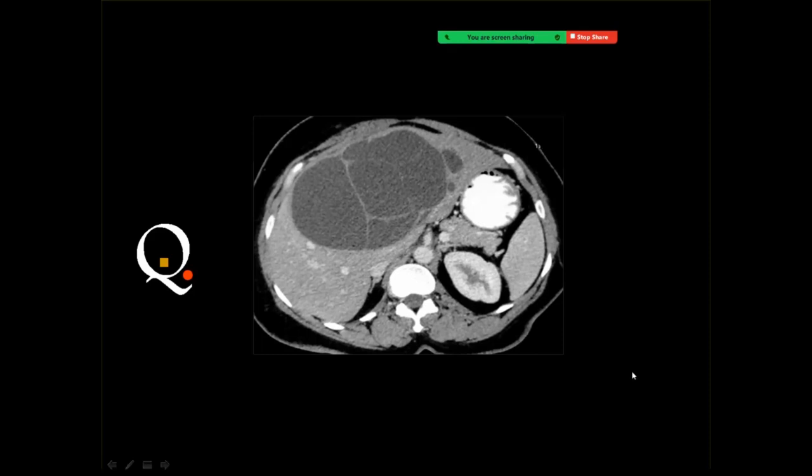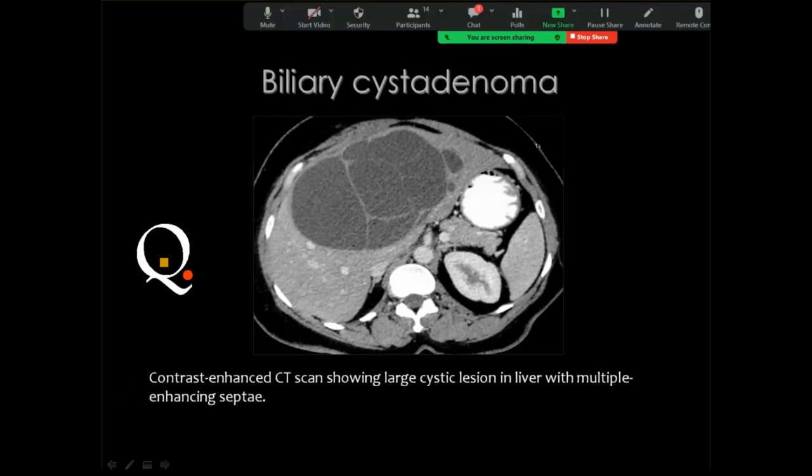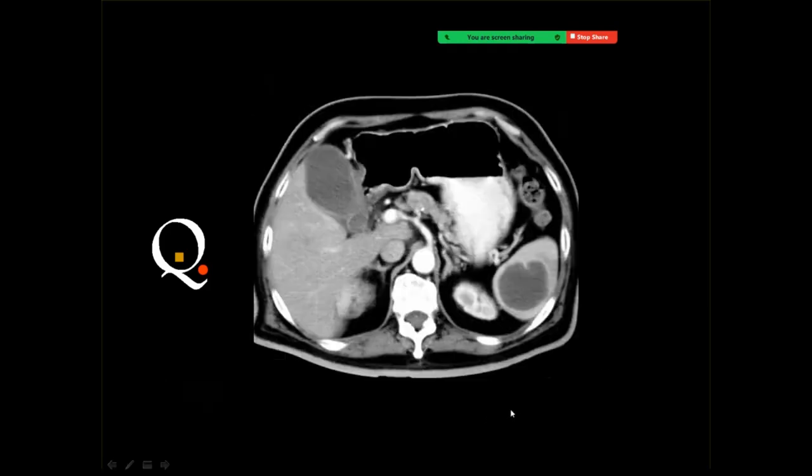Abscess, no, it's only a cystic lesion in the liver, which is towards the neoplastic site, and this is biliary cystadenoma. It is a big cyst with internal septation. It can show some calcium especially along the internal septation, and sometimes it can show some dilatation of the adjacent biliary radicals. And this is biliary cystadenoma.